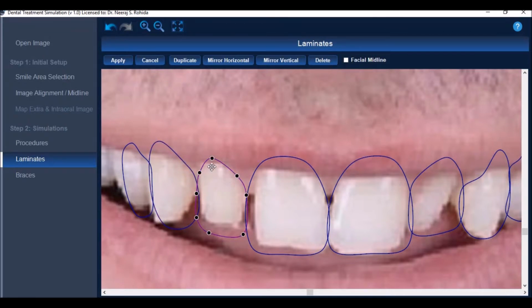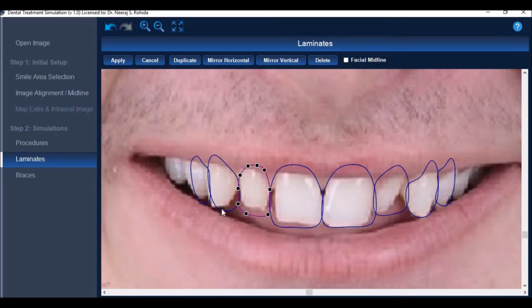When we want to edit individual templates, we need to follow the same principle, that when the cursor turns its shape to a double arrow, we can move it. If we press anywhere between 2 control points, the cursor turns plus shaped and we can add one more control point for better adjustments.